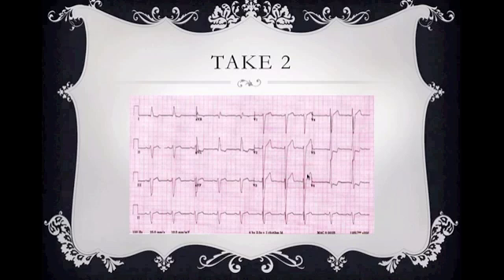But here's some ST segment elevation. Now remember what we learned so far. Is this concordant or discordant? Well, this would be discordant. It's discordant, and it's appropriately discordant. I also have some concave downward, uneven, asymmetrical T waves here. Those are not infarction T waves. All right? That is normal for your left ventricular hypertrophy, possibly some early repole going on. We don't know. We don't have echoes. We don't have an electrophysiologist at bedside. So that's what we have to go with.